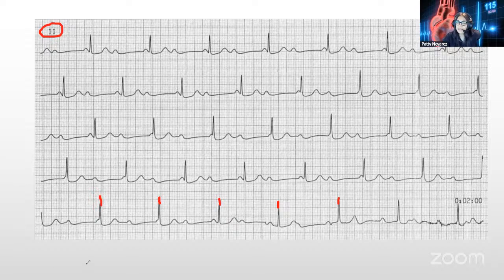The next step in the recognition is, are there P waves? And I can see, yes: P wave, P wave, P wave, P wave. This one should be kept in mind because there are 2 P waves next to each other. P wave, P wave. So I'm going to go ahead and recognize all the P waves on my strip. Let me just erase this because this is very chaotic. However, I can see that there is a certain pace to this. All the QRSs are there.